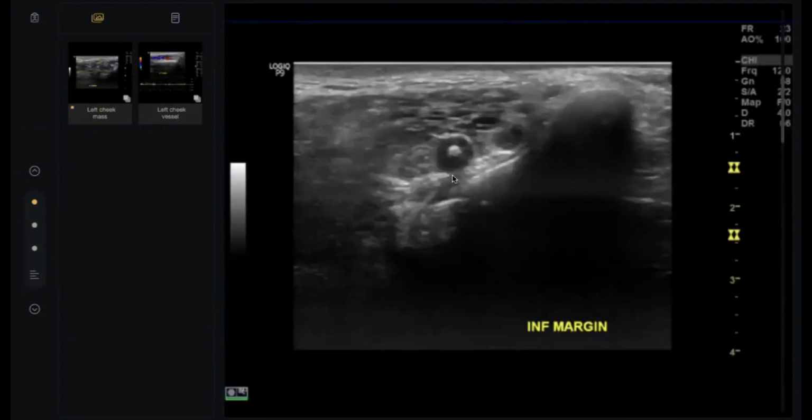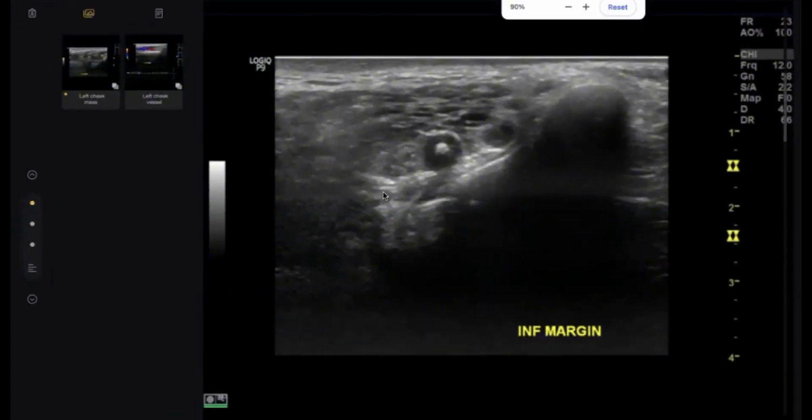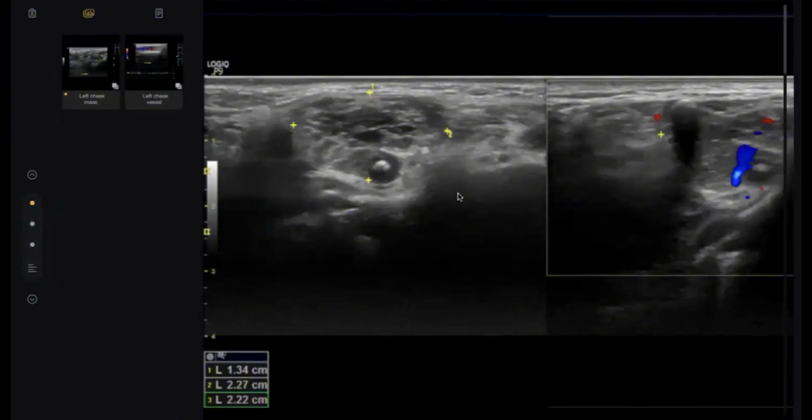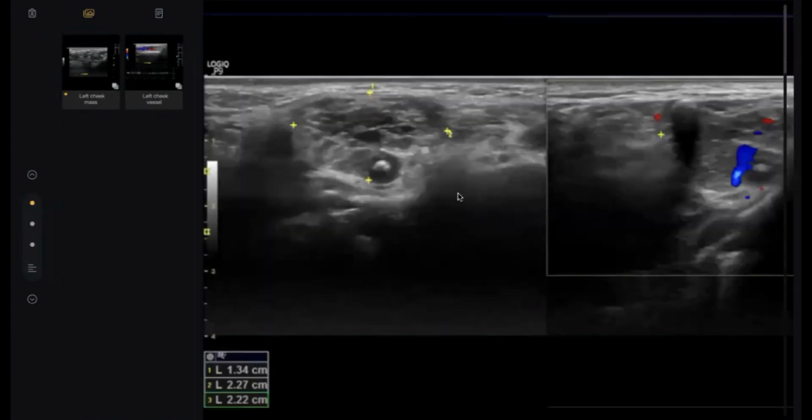Very atypical case. So don't expect a typical finding, like our doctor said. Doctor, it has some shadowing, by the way. See? It has some shadowing. Yes, I see it now. What should we do, my colleagues? We should guess. It's very important. I told you many times before, when you see the case, have a look and tell yourself, I should run in the pathway of vascular mass, vascular malformation, the most important vascular abnormalities.